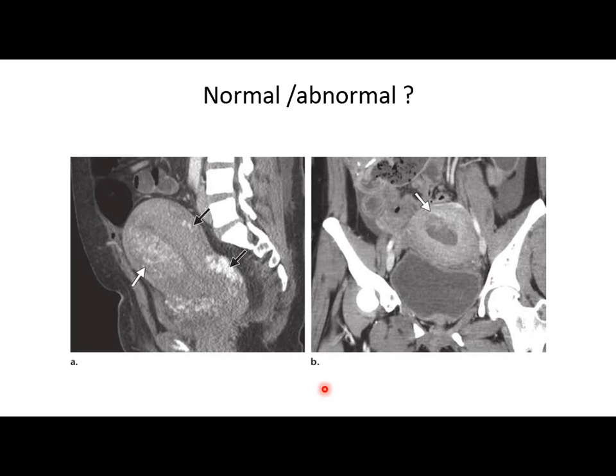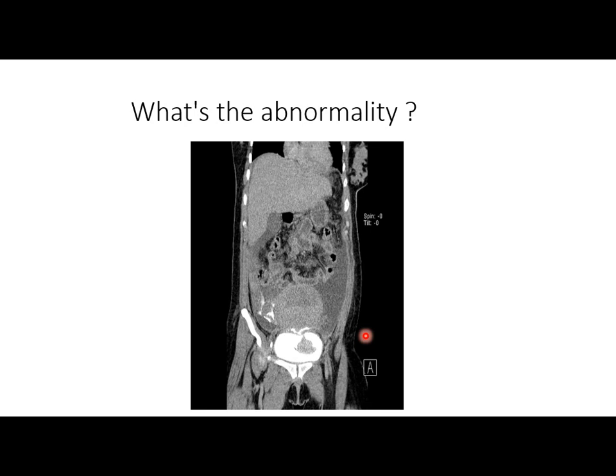The last one. Is this normal or abnormal? This part is normal placentation. Sign of placentation. Very good, so we are getting better. And what's this? What's the abnormality?